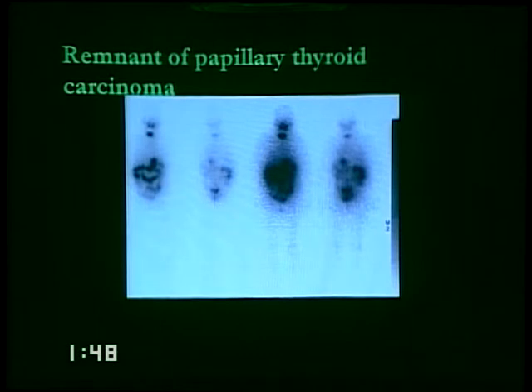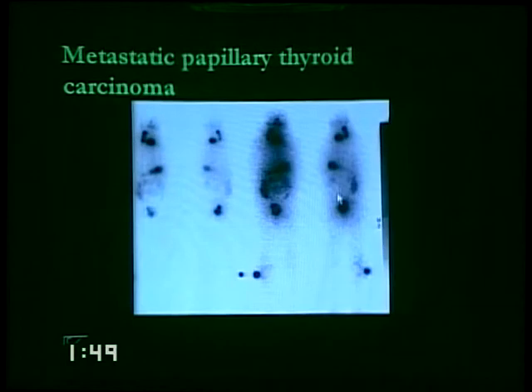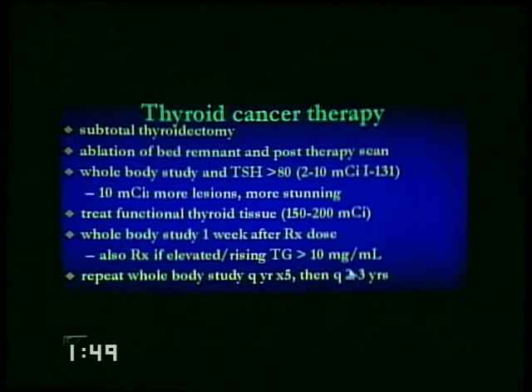If you have significant iodine-131 uptake, you know that there is tumor either within remainder cells or within metastatic new lymph nodes. It's that simple. Depending on how extensive the activity is, you are going to stage how progressive the pathology is. For example, not only do we have uptake within the neck, but we've got uptake distally. Very unusual, but you can get metastases anywhere in the body from thyroid carcinoma.